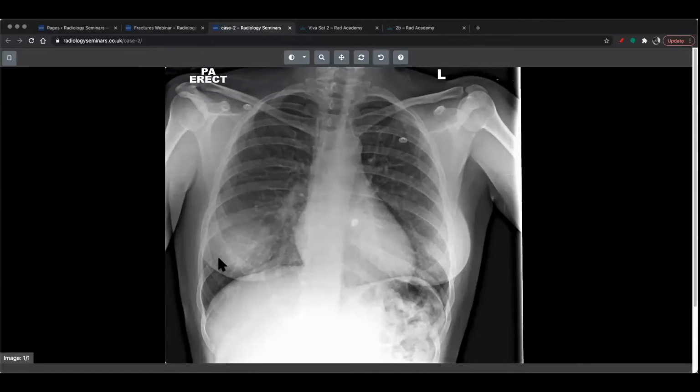So yes, I can see why you thought it could be a breast mass. And, fair enough, I think that's not a bad shout as well. But once you've seen it, don't just stop. I think sometimes we see an abnormality, but we don't think of the next thing. We think, okay, we're done with that film, let's move on. But actually, as radiologists or health professionals, we should be thinking about the next step, the next step, and the next step. And we should have a check system.